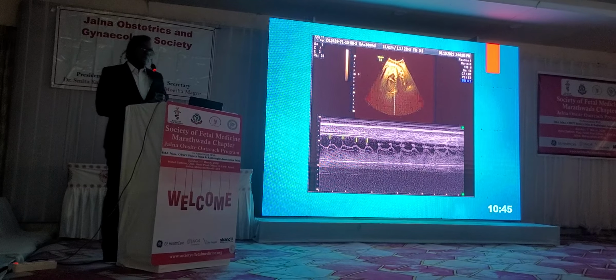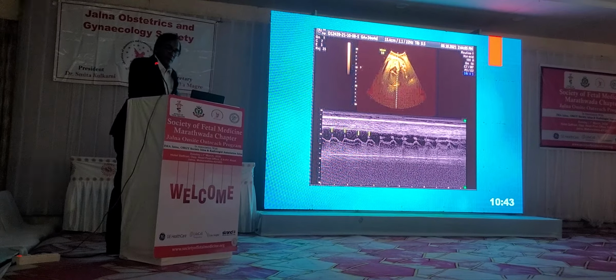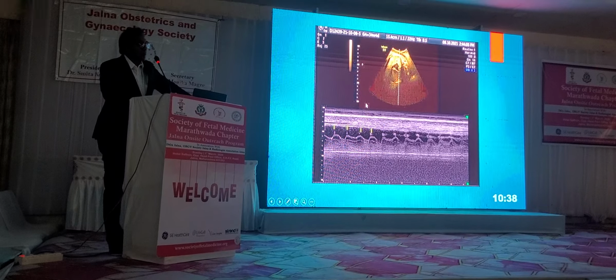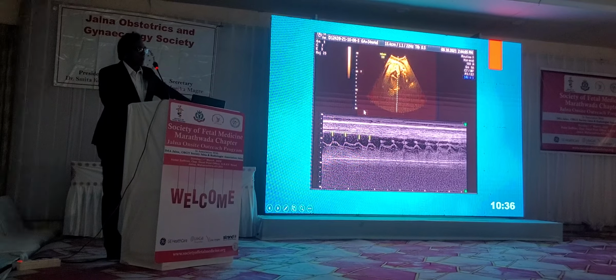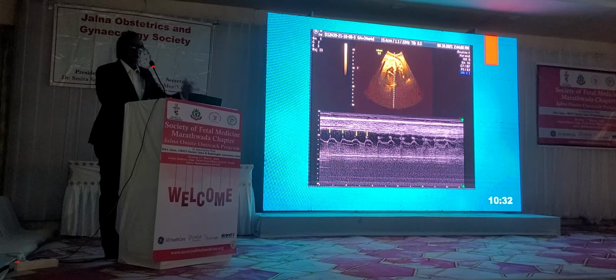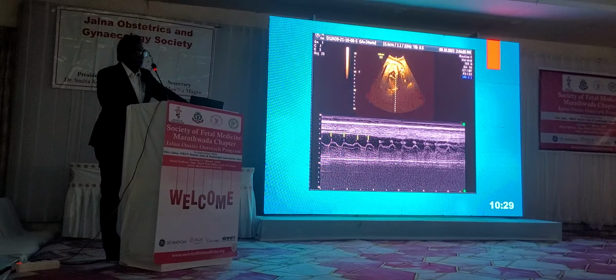M mode is a very underutilized thing in our armamentarium, which I feel should be used more because it not only gives abnormality of rhythm but chamber size, pericardium thickness, interventricular thickness, and many more information.